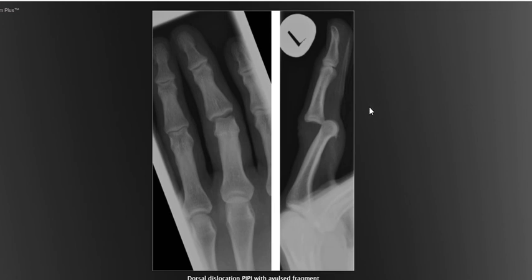And I believe due to the nature of this injury, we can pick up some clues from the DP view of how the middle phalanx has migrated across in that plane and is causing some deformity in the direction of the phalanx. Some of the clues before you actually take some images is the soft tissue deformity. Looking at this lateral here, there's a bulge with associated soft tissue swelling.